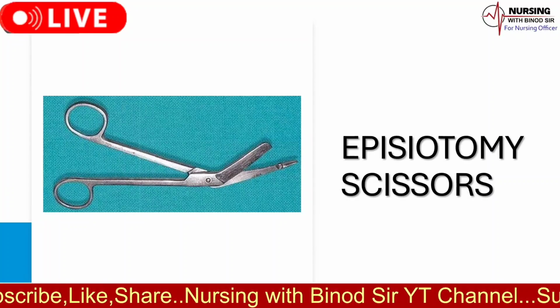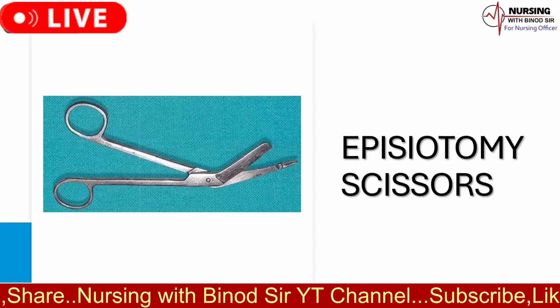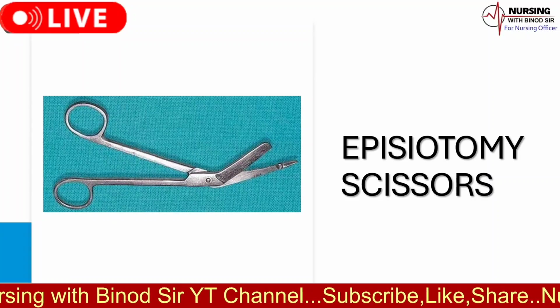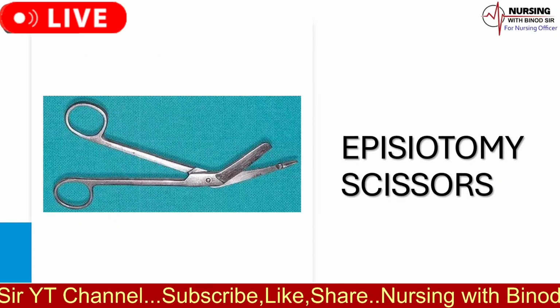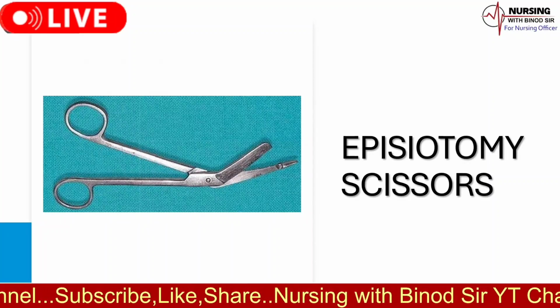Minimizing trauma. By providing controlled cuts, episiotomy scissors minimize trauma to perineal tissues, leading to faster healing. 5. Emergency situations. Essential in emergency obstetric procedures where a quick and precise incision is needed to ensure the safety of both mother and baby.